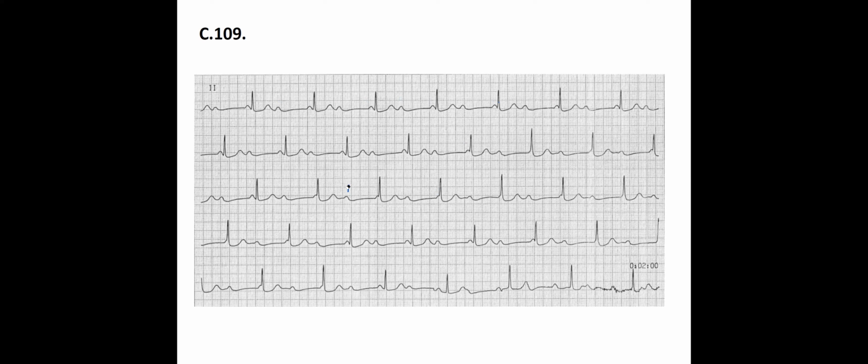Okay, now we do see rhythmic heartbeats. Yes, the RR intervals are constant. If you have a tracing on paper, mark the RR, and after you can shift it. If it's the same, fine, it's rhythmic. After that, look at the PP interval. This is rhythmic as well. However, if you look at the rate of the P, it won't be proportional to the rate of the RR. Now, it's simple. Look at the PR.